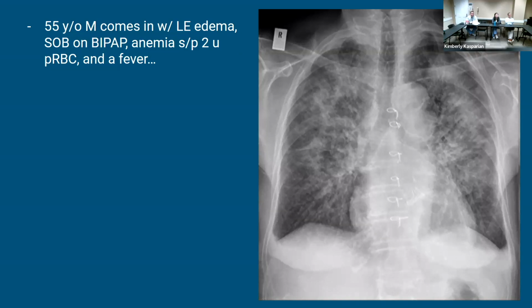So his airways are midline for A. B for bones, you can see your vertebral body, your clavicle, maybe a little bit. Not that bad. C, cardiac silhouette, his heart doesn't meet the criteria for enlarged, but it's on the bigger end, and his aortic notch is kind of prominent. D for diaphragm. My angles are a little blunted, I think, so I think he probably has bilateral pleural effusions, even though they're not huge. E for everything else.